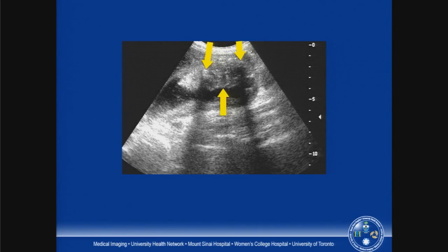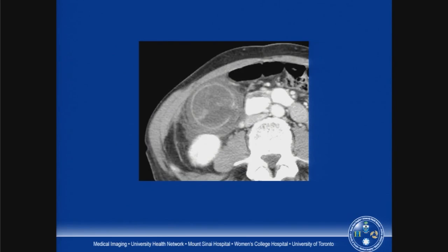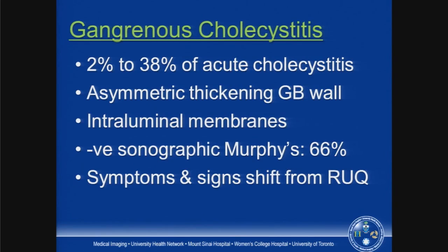And as we heard so nicely in the earlier presentation, we could use contrast ultrasound here, but this patient had a multi-phase CT. This high attenuation was present on the unenhanced images, so simply represents the gallstones. We can see a thin, smooth, enhancing gallbladder mucosa. There's some early gangrenous change, and there's pericholecystic inflammatory change, but no enhancing tumor mass. So we were very confident that all the changes in this case were due to inflammation, and the patient went on and had a non-eventful cholecystectomy.